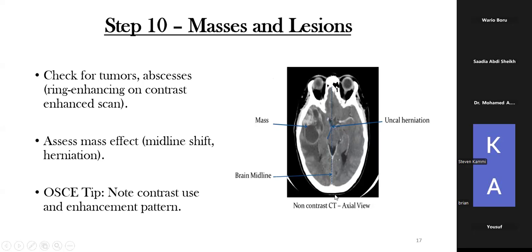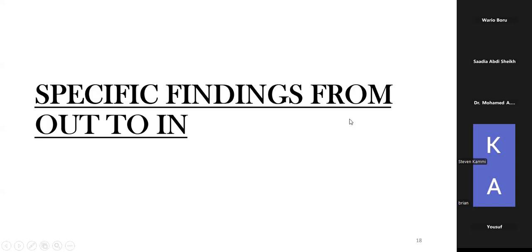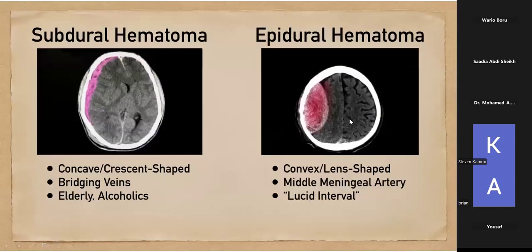So that is actually, sorry, this is a non-contrast. But here, then I think this is spillage because this one here should be the subarachnoid space. So most likely there's a bleed here or there's a lesion that has bled, so you can see that. Let me see one that is, yeah, like this should be a contrast scan. You can see, look at this. You can see the falx lighting up. Remember within the falx, what you have is the sinus. Look at this sinus here. So that's how you differentiate.